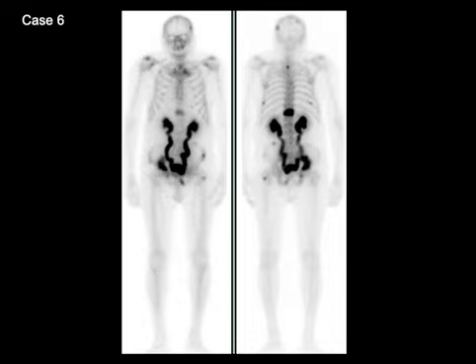Case number 6 shows a patient with osteoblastic bone metastases, and there is another characteristic finding here. This patient has an enlarged prostate, which we do not see here, except for the fact that it's indenting upon the urinary bladder and causing bladder outlet obstruction, because of which there is bilateral hydronephrosis and hydroureter. The osteoblastic metastases are seen in the skull, spine, and in the right side of the pelvis.